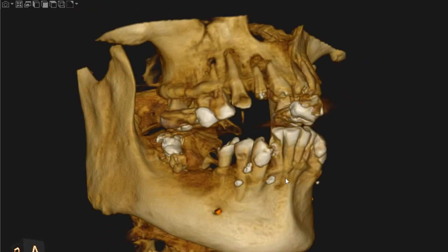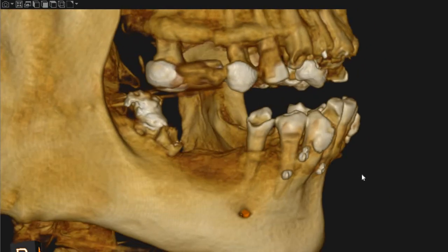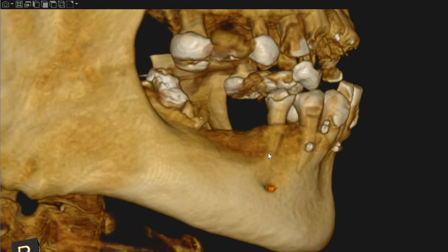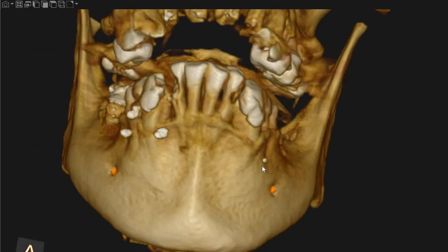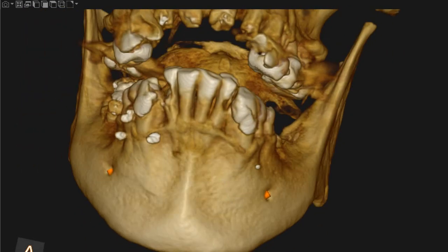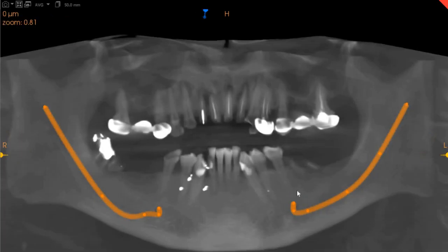These three spots that you see, we are expecting that these are some form of amalgam or some form of metallic elements that have embedded themselves into the gingiva. On the panoramic view, you can very clearly see that we've got severe periodontal disease, we've got periapical radiolucency, we've got endodontically treated teeth, and you've got edentulous spaces present as well.